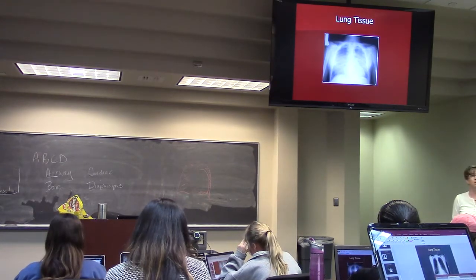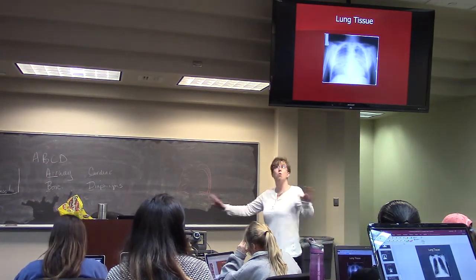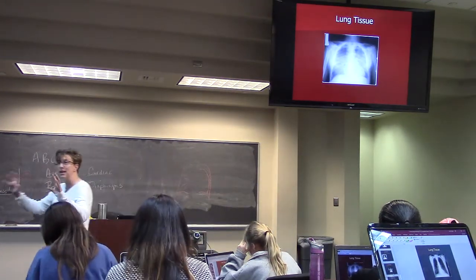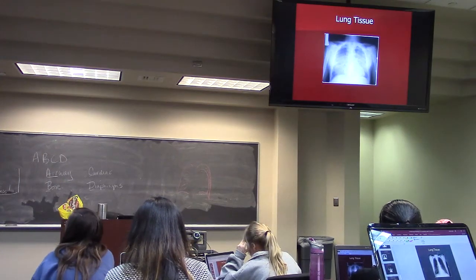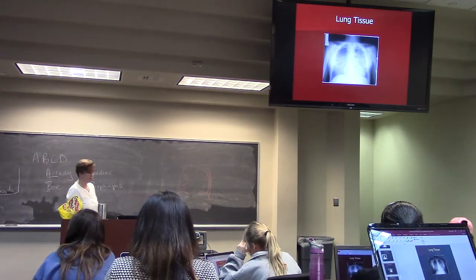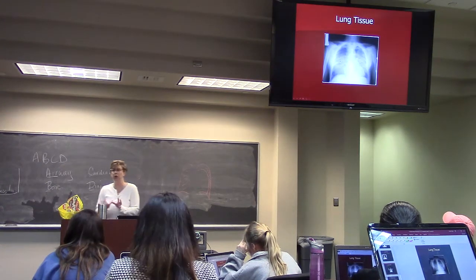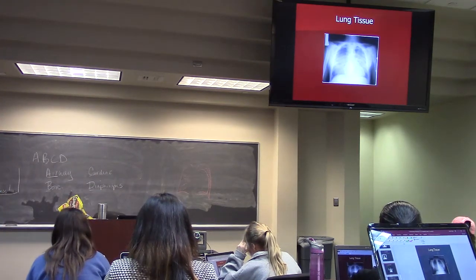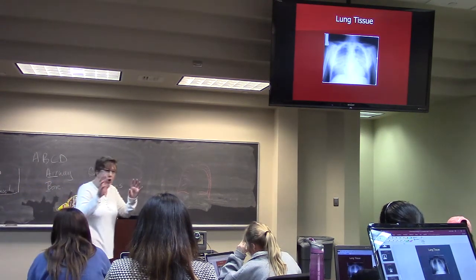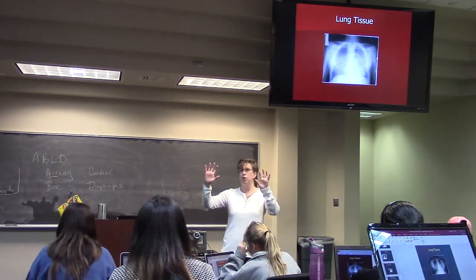Remember we talked about that going all the way out to about a third? That goes all the way out. You really see that white opacity going all the way out to the end. What you see is, look at all this. That's fluid in the lung tissue. In fact, it's really hard to even see darkness at the apices. You see a little bit, but it's really filling up with fluid.